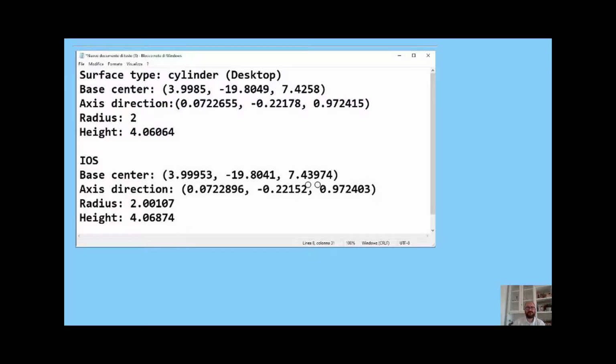I hope this part of the live session can be helpful for you for understanding deeply how to define implant axis and so on. Actually, in case you work with exocad, at the first step, exocad asks you to do exactly what I did during this presentation.